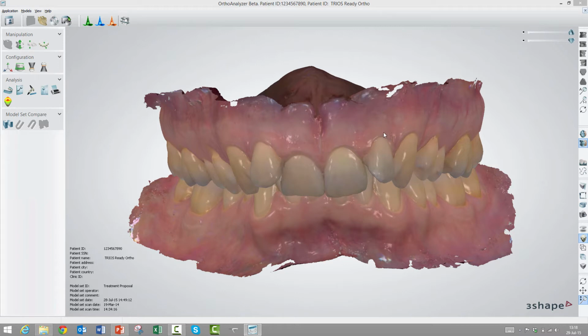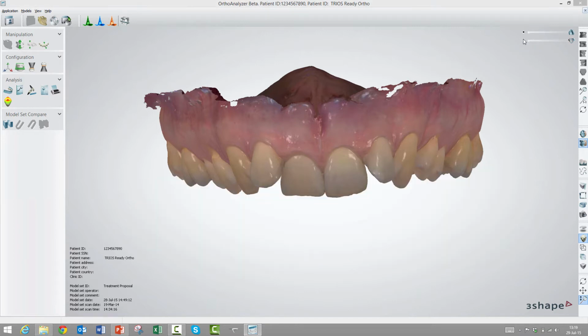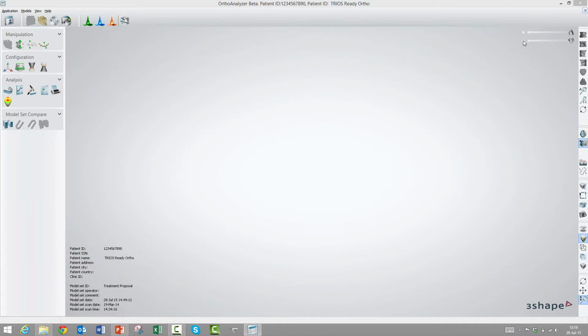Okay, let's zoom in here. The next thing I want to show is how these sliders work. Sliders are some of the panels you see up here in the upper right corners. We call them sliders. As you will see when you go into some of the other videos, you can have lots and lots of these sliders down here. Right now I just have 2, one for the mandibular and one for the maxilla, so the upper and lower jaw here. And you probably guessed it, you can remove one of the jaws by simply deselecting one of them here, both of them or one of them.